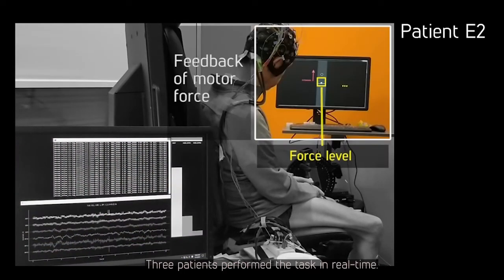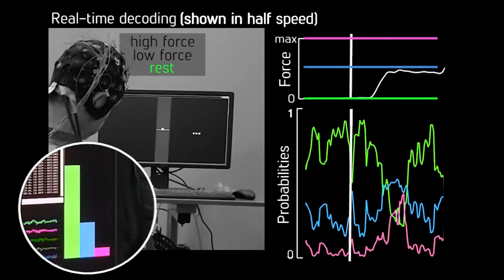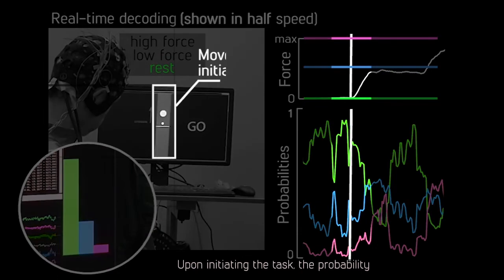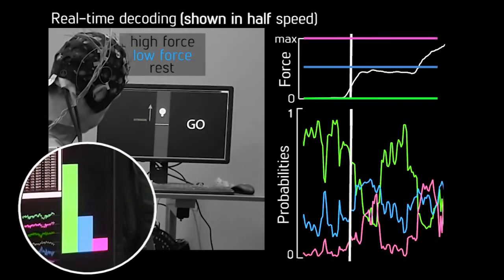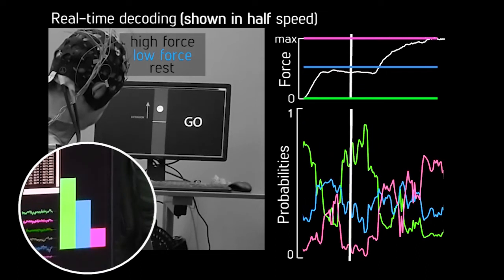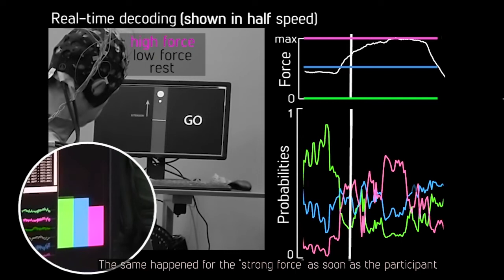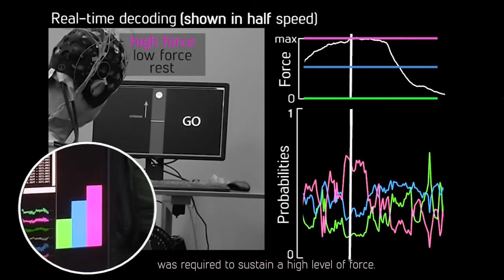3 patients performed the task in real time. Upon initiating the task, the probability of weak force became dominant. The same happened for the strong force as soon as the participant was required to sustain a high level of force.